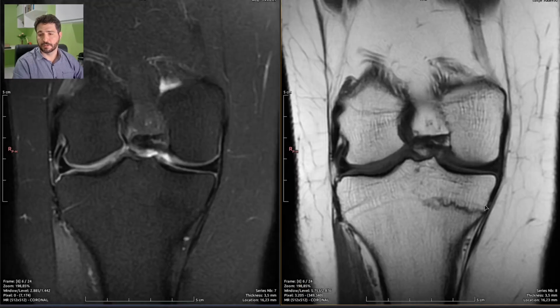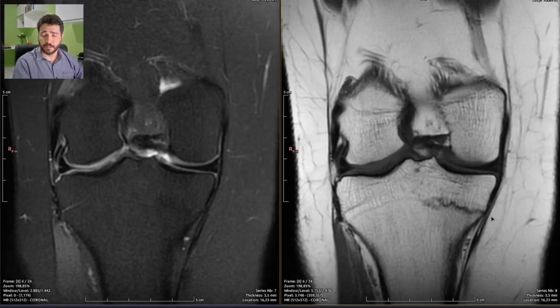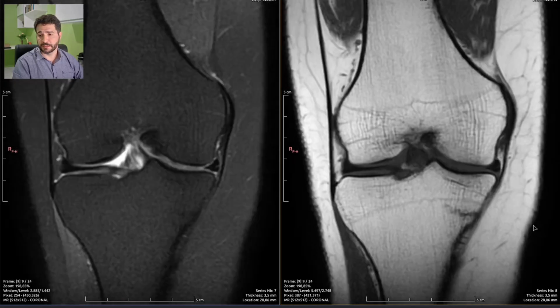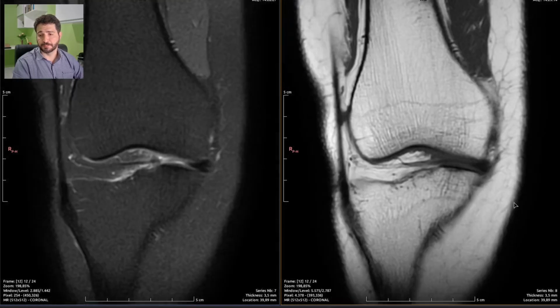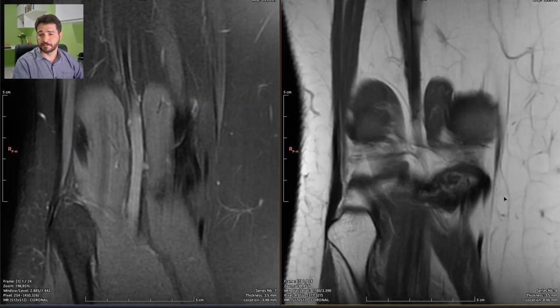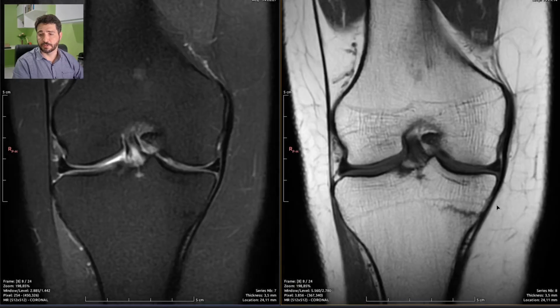See, the cortical bone is ruptured on the medial margin, and the fracture line extends inward and stops before reaching the other side, which makes it an incomplete fracture, which is much more common in cases of stress fractures from bone overload.